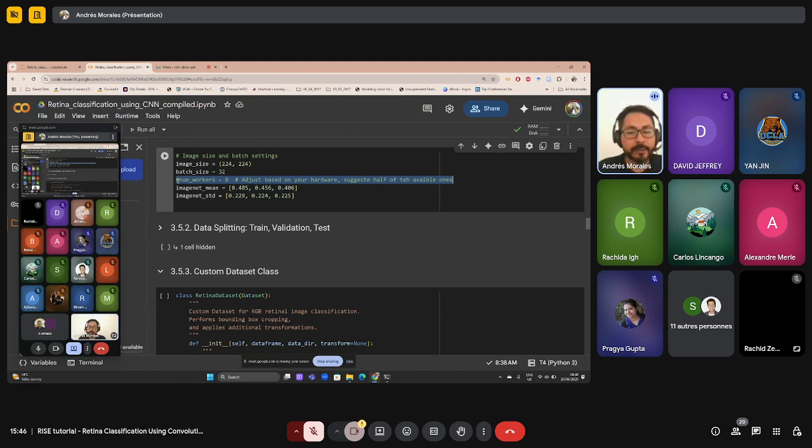So next, we are going to use some pre-trained models. So as you might know, many of the convolutional neural networks that are used nowadays, most of them, come also with pre-trained models, and these models were trained on a very famous dataset that is called ImageNet, that many of you probably have heard of.